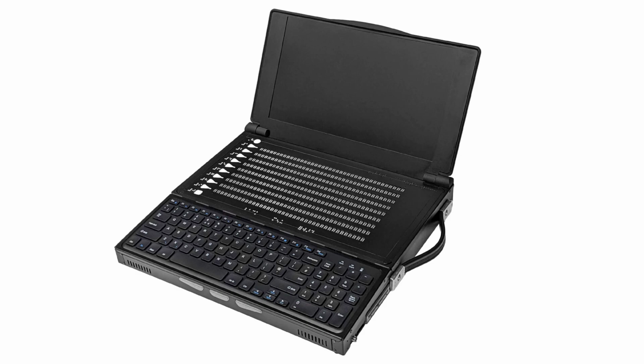Radio buttons are similar in that they have a field known as selected, which again needs to be set to either a Boolean value, true or false, depending on whether it is selected or not. However, radio buttons are different to checkboxes in that only one in the series that are displayed on the screen can be selected at any given time. So, when you are creating your form, ensure that only one of however many radio buttons you've included on your form is set to true. Otherwise, your program will crash, which nobody wants, do they?